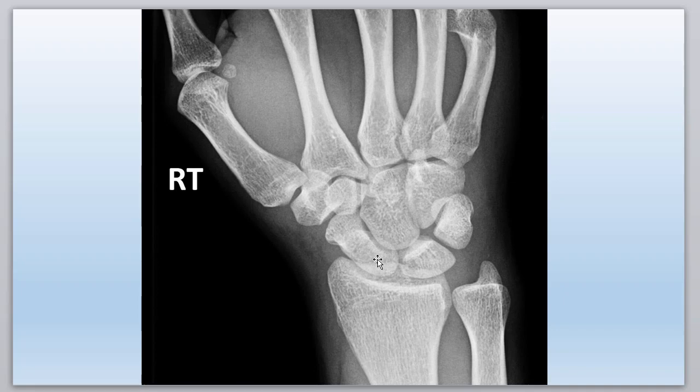Okay, I see it. See it right here. That's a fracture. That little thing is a fracture. So this would be a sneaky one, right? Because you can hallucinate lines all over the place. But this actually did turn out to be a fracture. It looks like we got a little soft tissue swelling here as well. See these lines here? And there are signs, fat pad signs here. I'm not going to get into all that, but that's why it's hard without knowing the history. It's hard to see fractures.